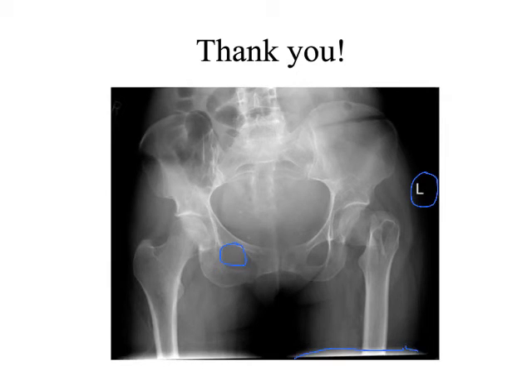The two femurs look very weird, it's like the one's turned, one's not. Yeah. Which one appears to be appropriately positioned? The right, because we can see, what can we see right here? Greater trochanter in profile. But you can't see it on the other. I don't see the greater trochanter in profile here. Where is the greater trochanter? How is that possible? I don't know. Because you can see the lesser trochanter a lot better.